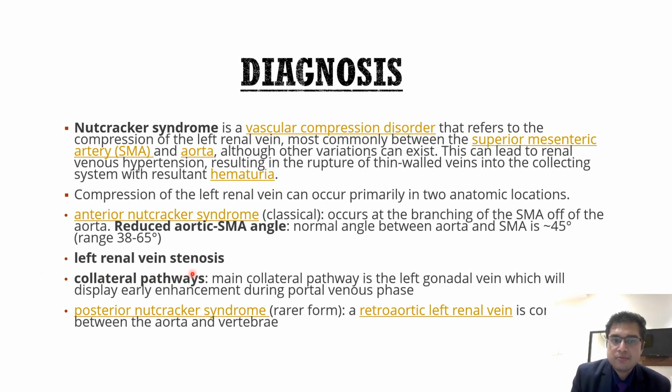We can also identify some collateral pathways in certain cases where the main collateral pathway is the left gonadal vein, which will display early enhancement during portal venous phase.